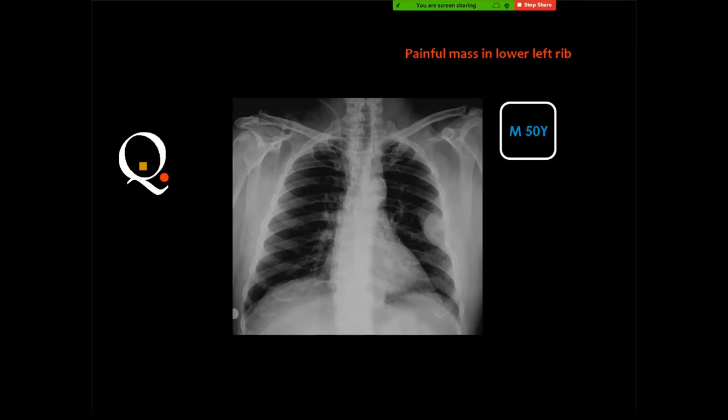Assalamu alaikum. Alaikum salam. Chest X-ray PA view. Yeah. Chest X-ray PA view showing focal lung lesion of an obtuse angle, oval shape, radio opaque density based on the left lateral chest wall from inside, denoting that it could be originated from the pleura because it's obtuse angle with the surrounding lung parenchyma. Yes, very good. If it is of pleural origin, what do you think?